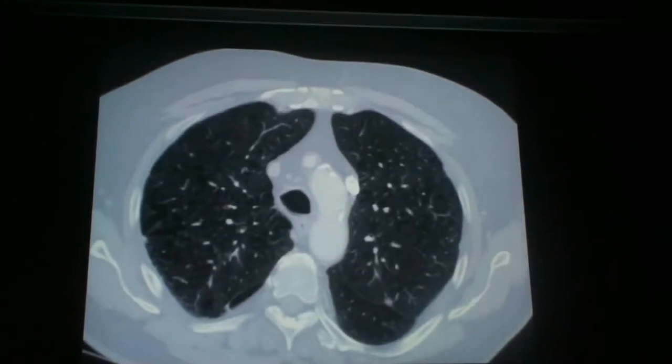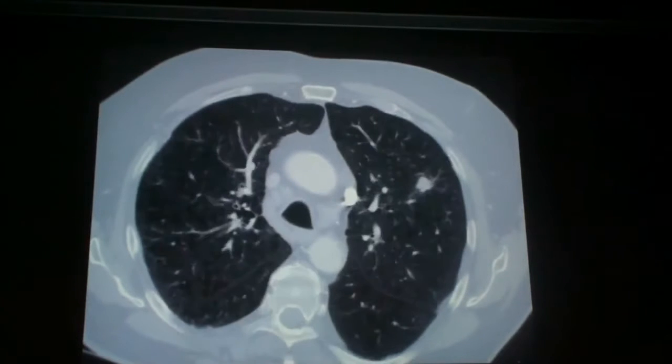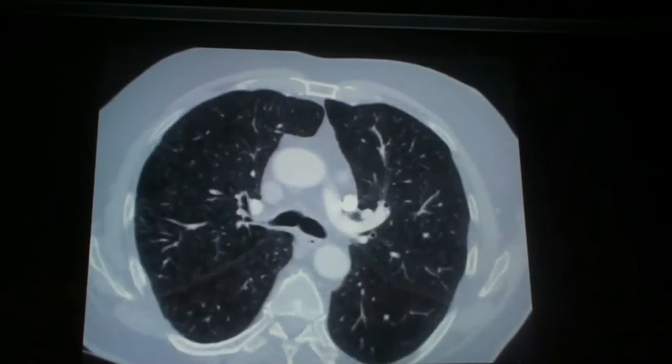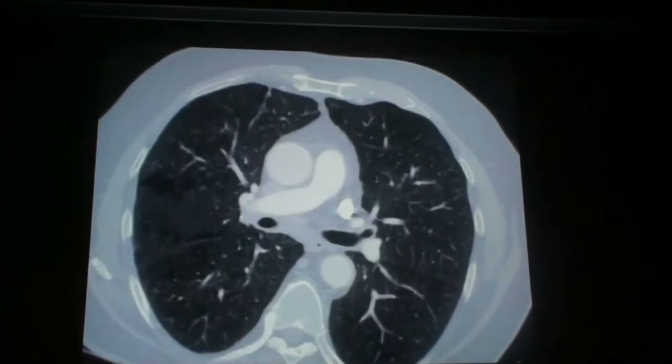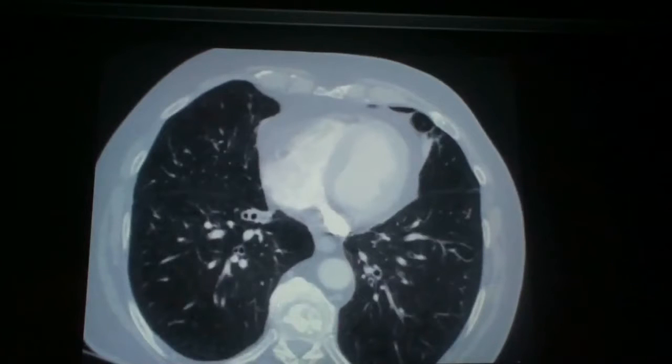And I want you to depict at least 3 different abnormalities, okay? So pay attention.